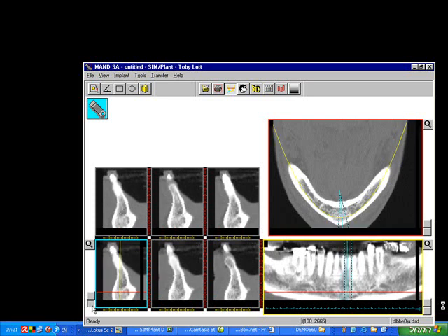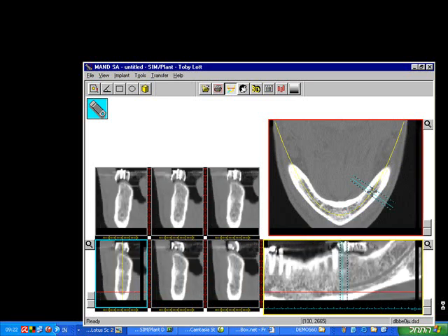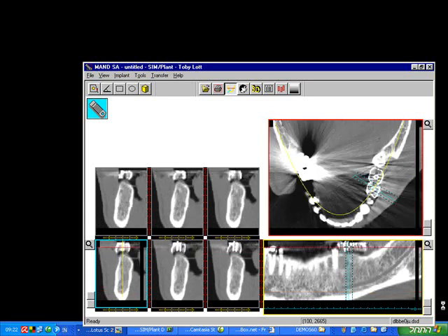When you are treatment planning, rather than using the arrows to move through the images, you can simply point to any area of interest and click. To look posterior, click here on the axial. To look at the appliance that was used, click here on the panoramic. To center in on the mandibular nerve, click here on the cross-sectional.